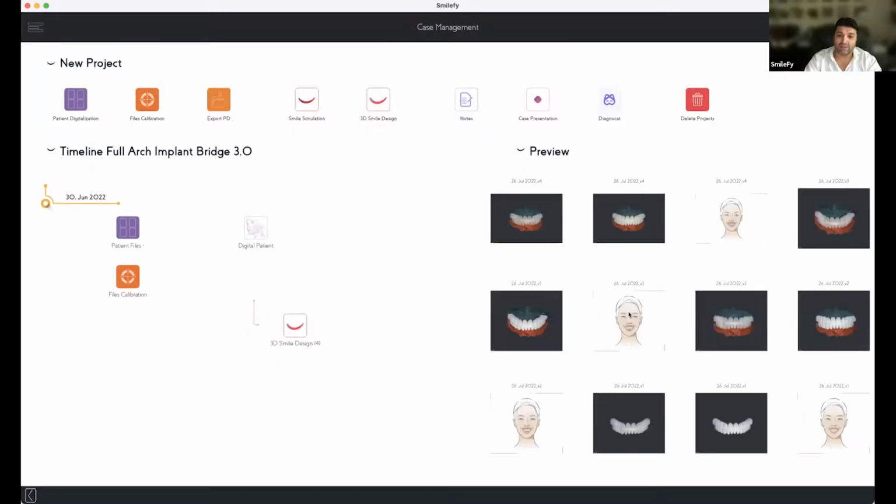Yeah, then with the calibration, it is very, very delicate. Just make sure that the landmarks that you select from the picture and from the intraoral scan are as precise as possible. Then we're going to be able to have a very good calibration, and then with small adjustments you are done. We used to be able to get good alignment with 3D files between photos, picture, scan, and IOS, but making a good alignment with the 2D pictures and the 3D IOS is not easy.